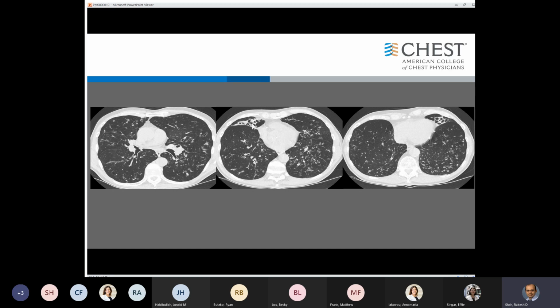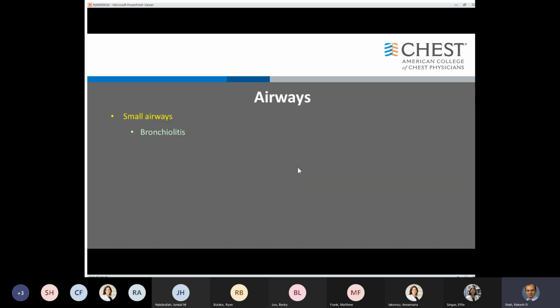This individual, you can see, also has bronchiectasis throughout their lungs, but it's predominantly in the middle lobe and lingula, and they're very thin, and if they're elderly, you know, and of course we see a lot of this here. This would be a MAC infection. So classic distribution is middle lobe and lingular. It doesn't have to be, but if you see that, then it helps, and you may see some tree and bud opacities as well.